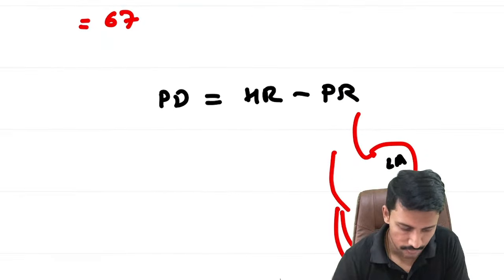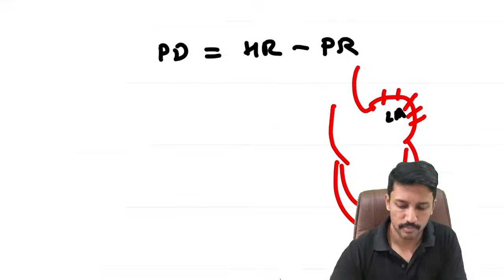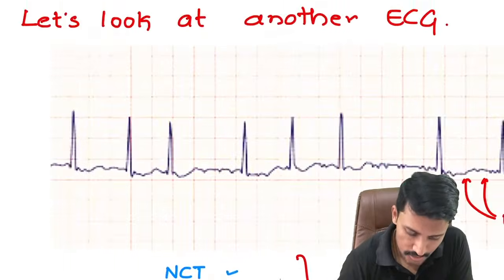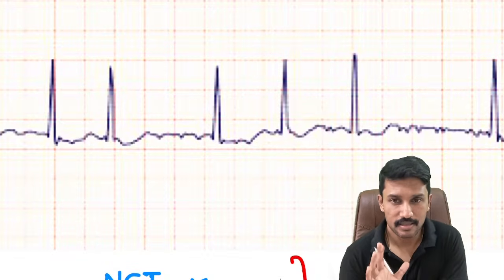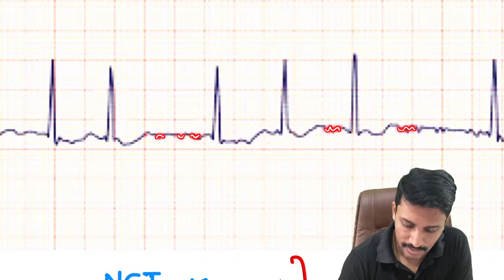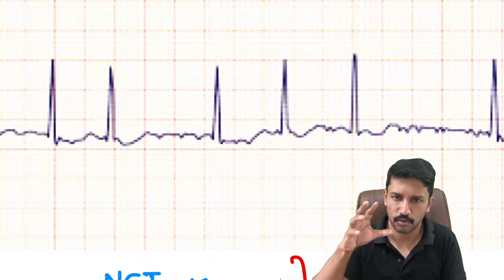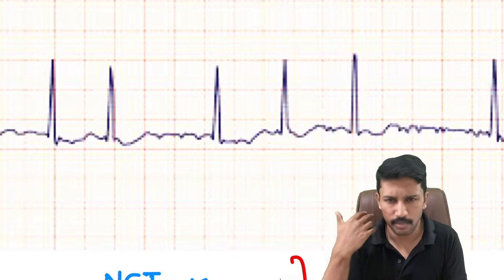Okay, now I'll come back to this ECG. So in atrial fibrillation, the atria is not contracting. It is merely vibrating or shaking. When you see the atrial fibrillation ECG, you can understand. I did not get morphologically clear distinct P waves, but I had some baseline undulation, right? Some electrical activity happening at the atria. Some of this electrical activity may have reasonable voltage for the atria to generate some degree of contraction. Some of it is absolutely ineffective.